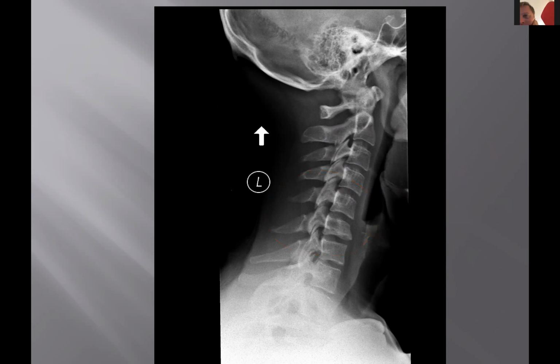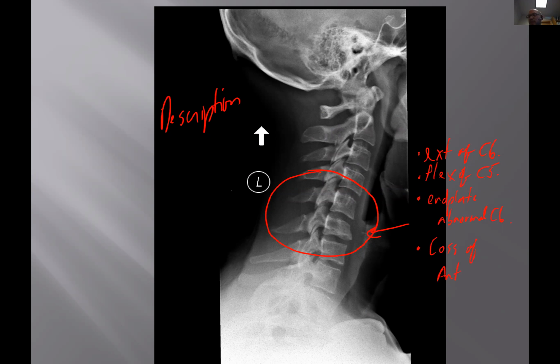You know why I like what you said? You have a tendency to just say a diagnosis, but instead, let's just do the finding, which is loss of anterior vertebral body height. Excellent. I'm having a hard time with my periods; they're causing it to move. I will forget putting periods on this. Okay, what else?